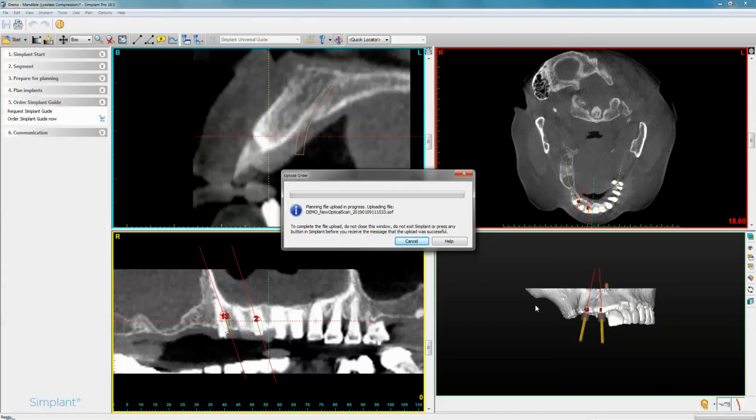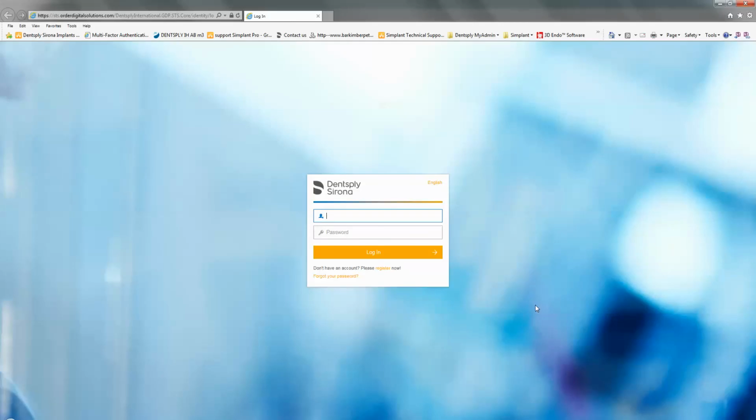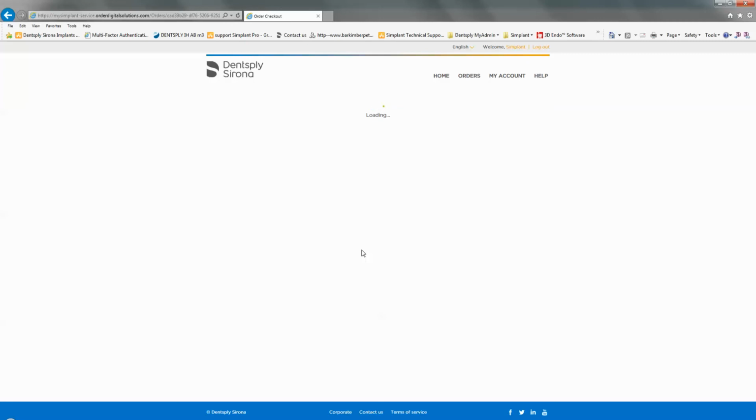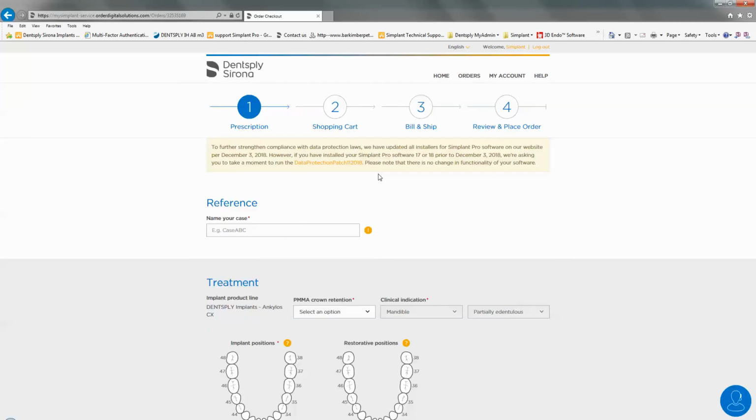Again, give it a few moments, it should eventually load up. Here we are again, so let's log in. Once you're logged in, you shouldn't really have that error message again. Here we are. So we're in the ordering platform.